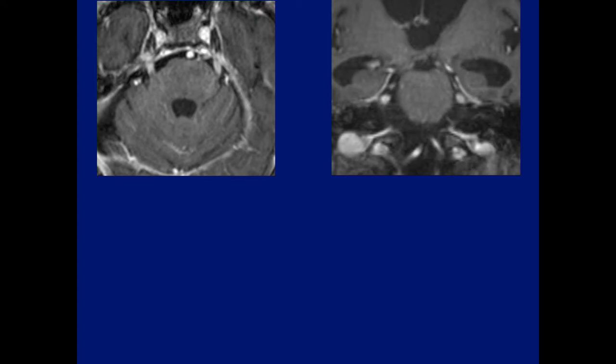Okay, what's a possible etiology of these abnormalities, which are frequently seen at SMILO? Anybody? Pathology, any pathology? Correct.